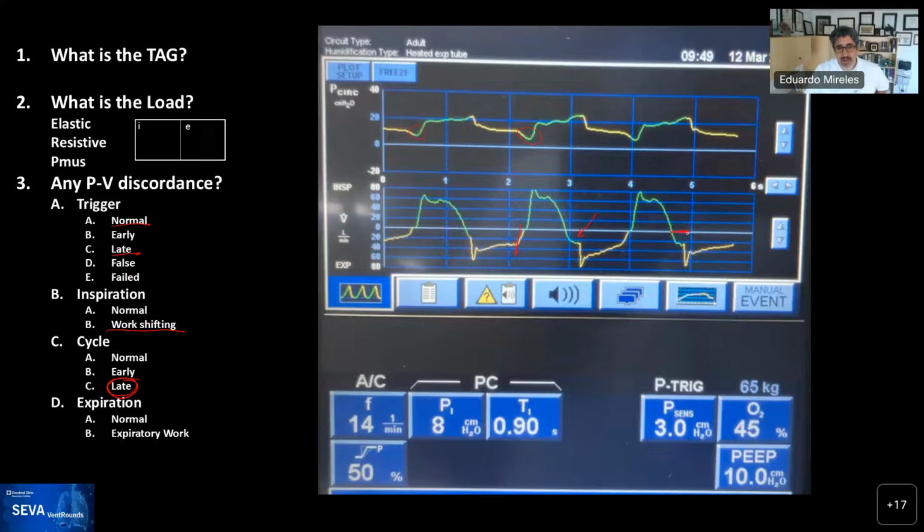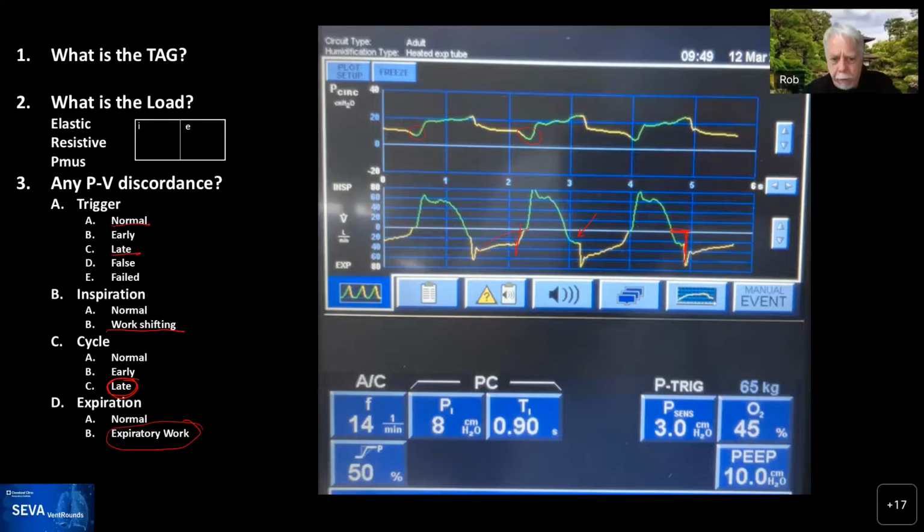The area that you've colored in red, to the ventilator, that's negative volume. So it subtracts that off of the positive area, and the peak of that should be the tidal volume. You're not displaying the tidal volume waveform, but it's not calculated that way.